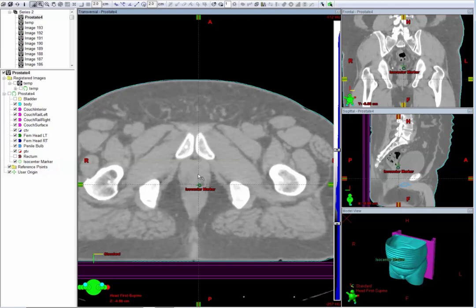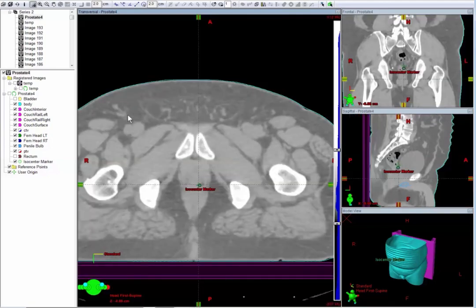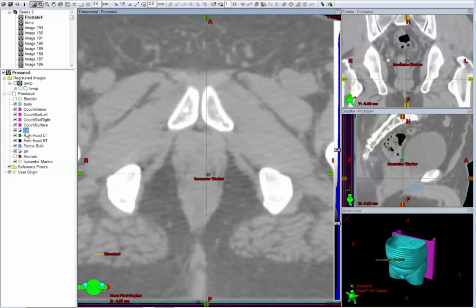But other definitions say that if you look here on the sagittal image, the PTV comes down to but does not include the penile bulb. So we'll see how that works out when we draw our volumes. So I am going to magnify this yet again. That's maybe a little too much. Magnify this again, and I'm going to start drawing my CTV.